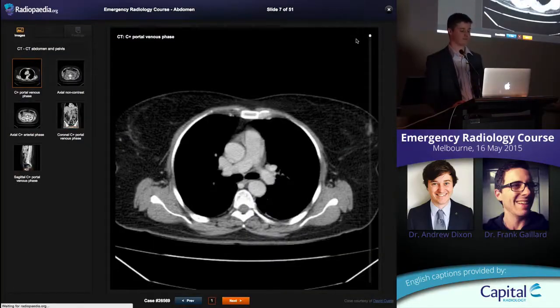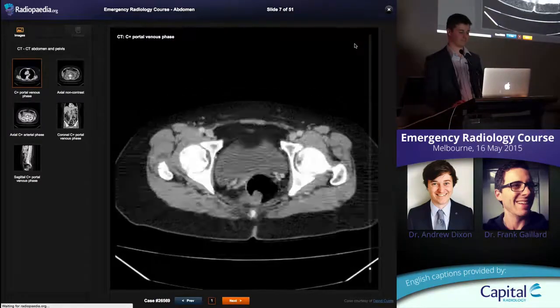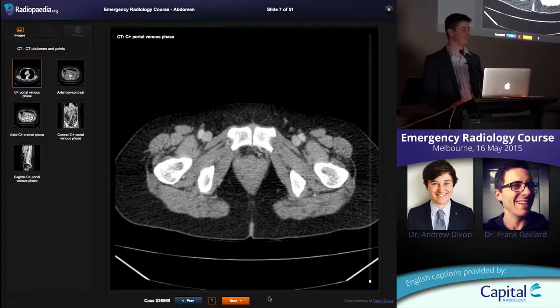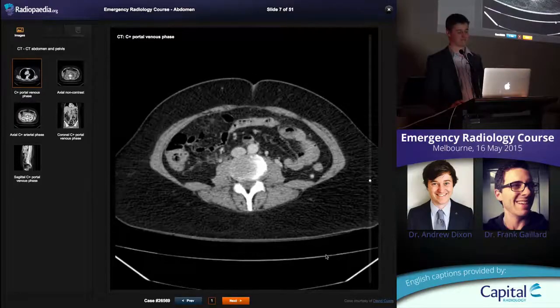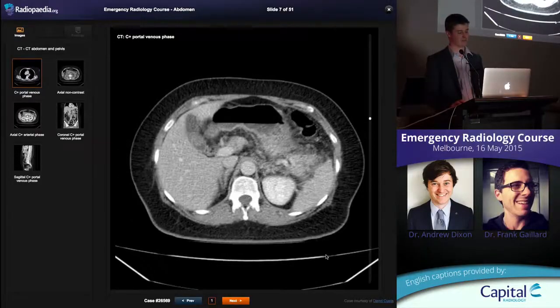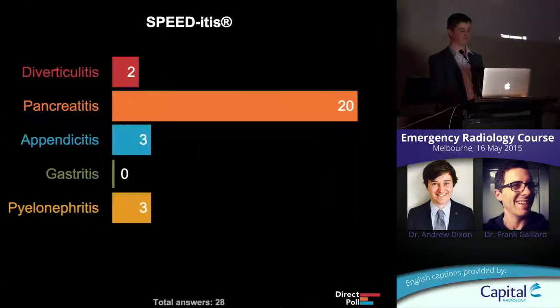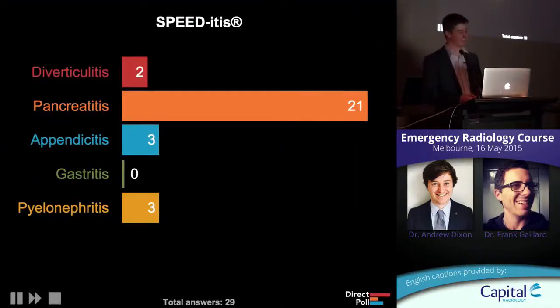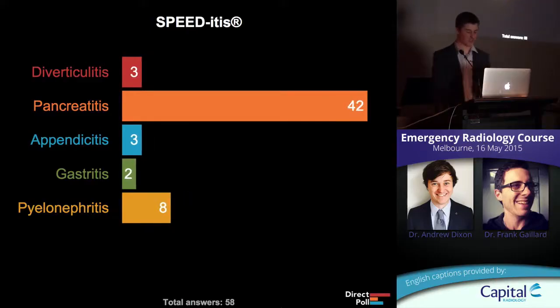Everyone ready? All right. How'd you go? You want another go? You want slower? Oh, come on. Has anyone spotted it? Anyone confident they know what it is? All right, vote. Let's go. Oh, look, you do know what it is. It's pancreatitis. Good job.